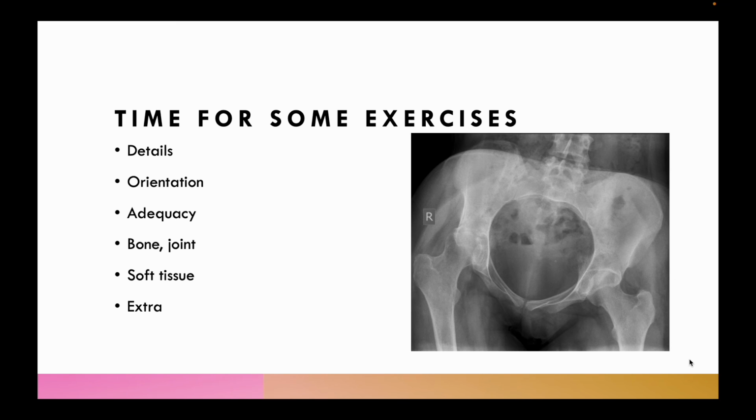Then coming to orientation. The right hemipelvis appears to be tilted proximally compared to the left side. The right proximal thigh is in adducted position compared to the left side, which is in abduction. The spine tilted towards the left side, along with the tilting of the pelvis.